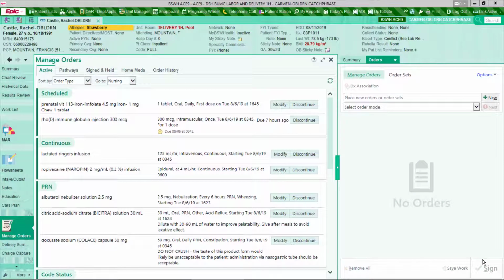In our last session, we discussed how to properly reconcile medications pulled on override from the cabinet and matching them to an order. And in that lesson, we entered an order. This lesson is about other things you can do with entering orders, modifying, and discontinuing them.